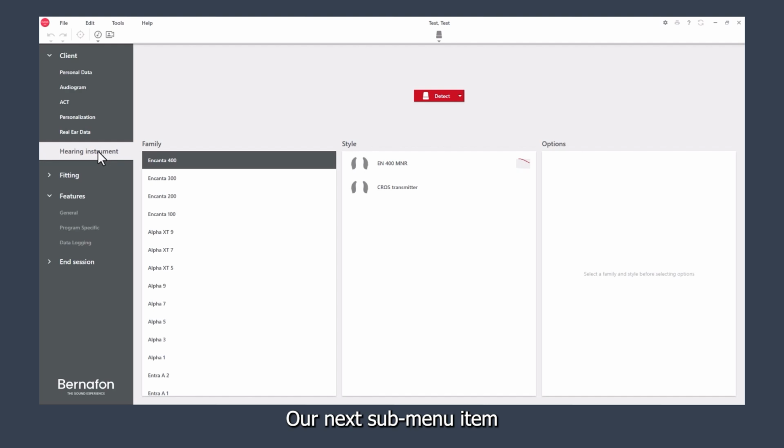Our next submenu item is Hearing Instrument. Here, you can simulate hearing instrument fittings or detect the attached hearing instruments. To detect, simply select the Detect button or detect using the icon at the top. Both methods require us to select the appropriate programming interface if you have more than one connected to the computer. If you only have one programming interface connected, then there will not be a drop-down arrow.